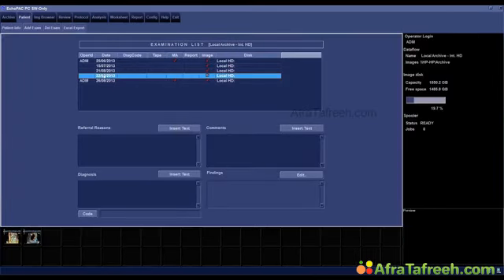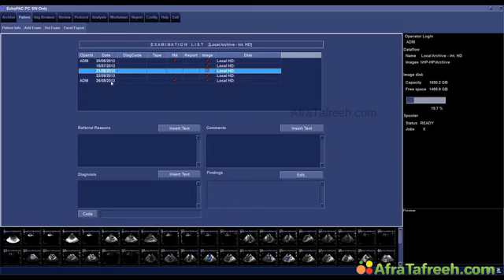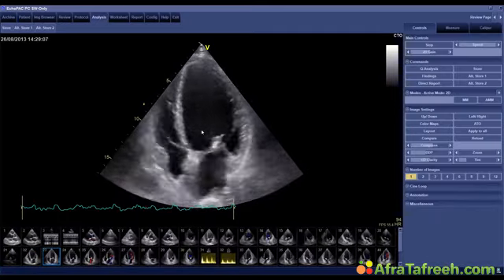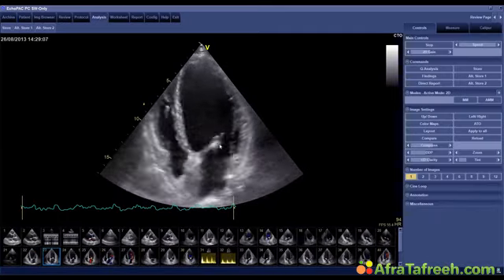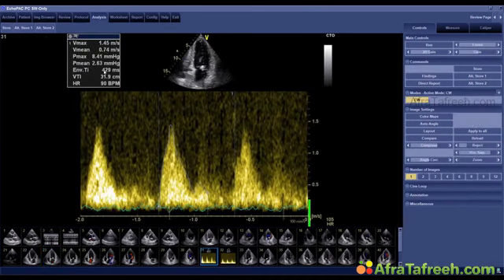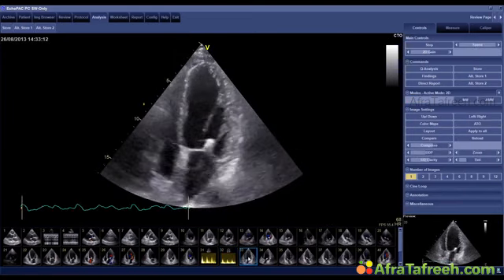But let me just conclude with this case because I have so many other things I want to show you as well. I want to conclude just by showing you the final echo of the patient. This is back to transthoracic, and 2 things which are interesting. First of all, here's the clip. That's how it looks. The second thing is you have a gradient across the valve, so you have an orifice which is smaller. But if you don't do too many clips and if you don't completely close the orifice, you will have enough flow that you don't have significant stenosis.